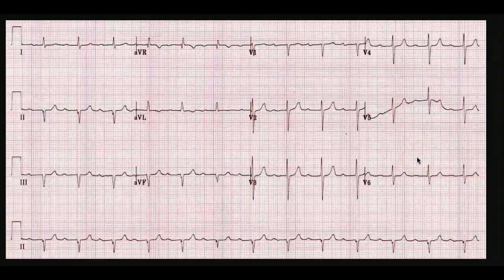Okay, so now let's look at this EKG. We see that we are starting to see Q wave here. So lead 2, lead 3, again in lead 2, okay? Anywhere else we see Q wave? That's pretty much it. But it's not followed by an ST segment elevation. So this is a typical example of an old infarct. We see the Q wave because of lack of electrical activity there, but really there is no ST segment elevation.